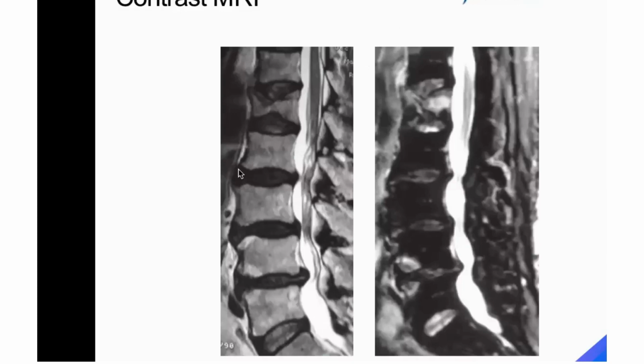Look at this. This is a T2 image. It looks like a healed vertebral body. Okay, healed. But if you go for the contrast, you can see there's a lot of activity going on inside.